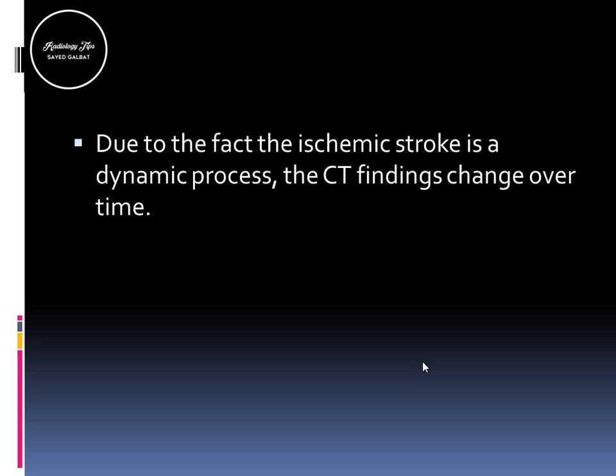So the first step, as I said, is that the CT findings in infarction change over time. You won't expect to see the same imaging feature in each patient, even in the same patient at a different time. If you image the patient a few hours after the infarction, then further hours, then days and then weeks, you will see some changes. These changes are related to the healing process of the infarction, and not only to the healing effect. It may also be related to complications.